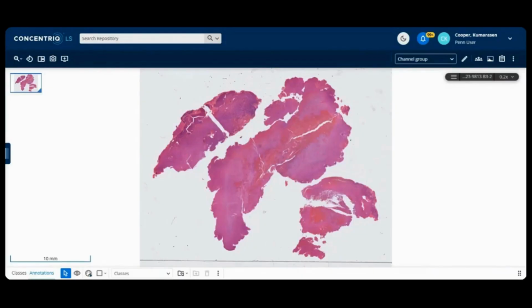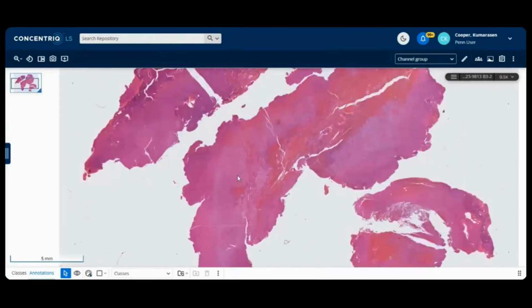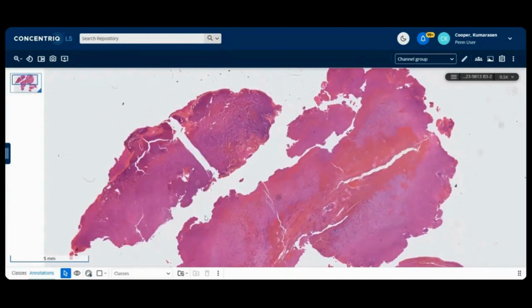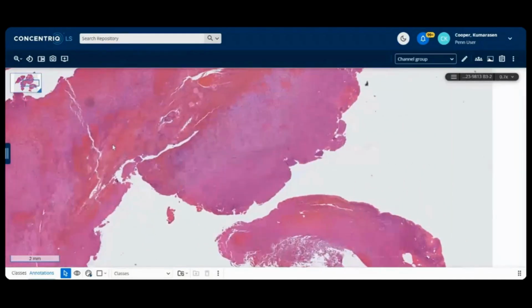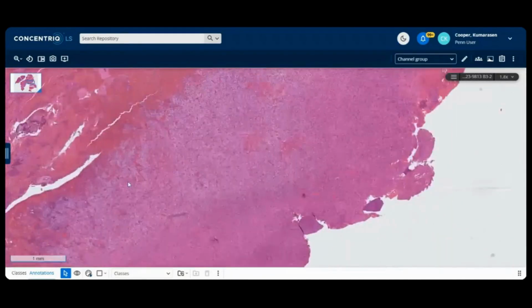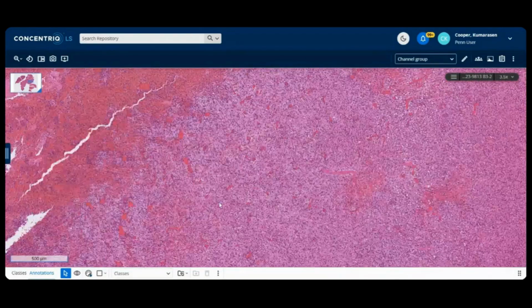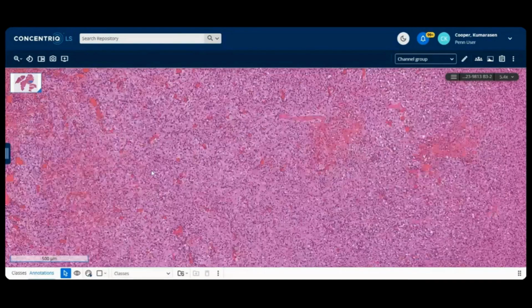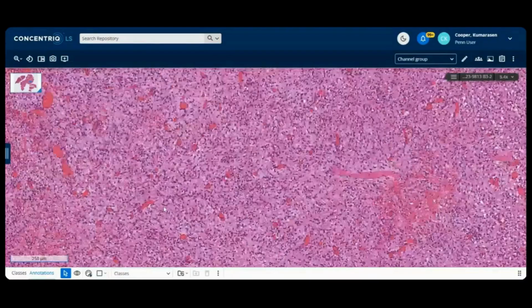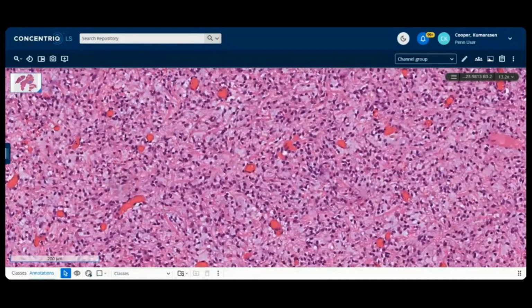Okay, let's take a look at this one. Why are the slides so dark on this group of slides? I don't know. 24, male. So this is a recurrent neck mass. I'm going to try and find you some nice areas to help you. So it's pretty similar. It's a mesenchymal tumor, and unfortunately this guy had many recurrences, and this is one of those recurrences which I put a slide into this seminar.